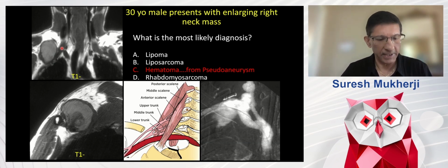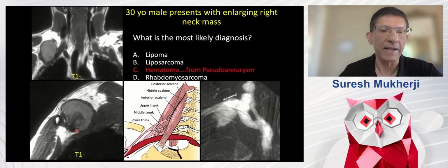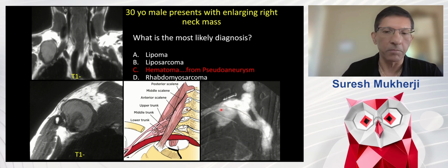When I see something like this, I want to make sure it's not an aneurysm, and not something that if the surgeon biopsies, they're going to be really upset at me for not thinking about it. And this is another example. This was years ago. If you look real closely, this was a patient that had a gunshot wound. That's a little bullet right here. And this patient had multiple pseudoaneurysms involving not only the carotid artery, but the brachial plexus. This ended up being coiled and the patient's brachial plexus symptoms resolved.